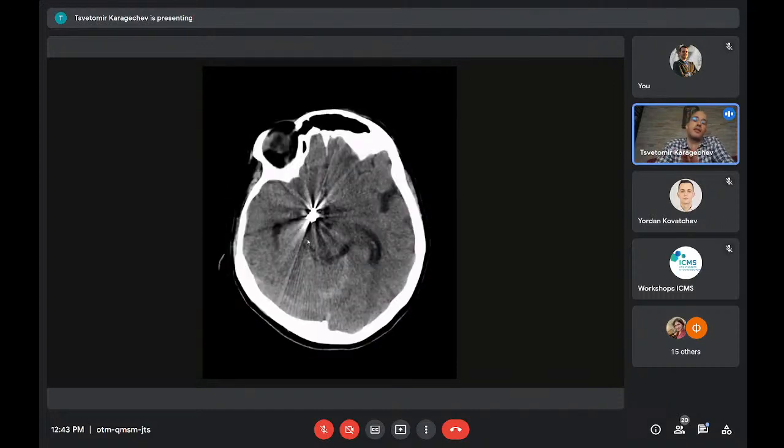And again, this is another example. This is actually no calcification. You can see a hyperdensity in the basal cistern. It's really, really dense, and you have these streaks around it. These are artifacts. This is actually metal. It is denser than bone.